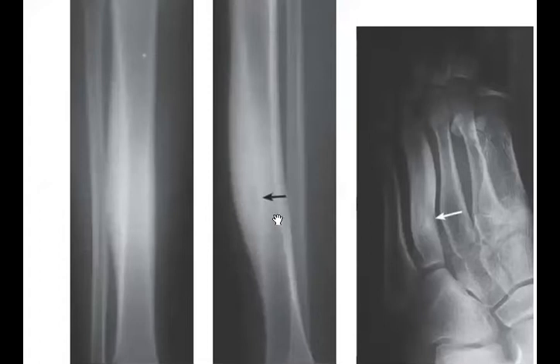So the most typical one will be the osteoid osteoma. Perfect. So osteoid osteoma can just present with sclerosis like this. If you're lucky, you can see the nidus, and sometimes you can see it like this appearance, and you can have some deformity, double density. I agree with you.